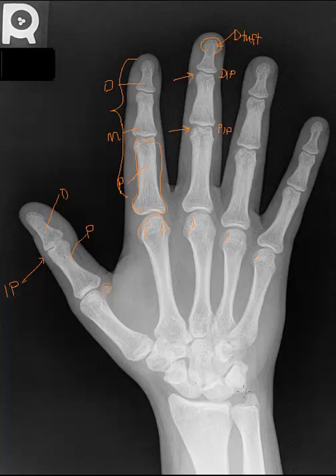There's another region that I wanted to talk to you about in the wrist, and this area is reserved for the triangular fibrocartilage. And fibrocartilage is not radiographically visible, but is still present. The reason why I'm discussing this region is because oftentimes students want to say that there is a ulnar carpal joint, and that's not necessarily true. This triangular fibrocartilage lives in this region and essentially cushions the space between the ulna and the carpals. So the radiocarpal articulation is the articulation that we really talk about, as it does have hyaline cartilage and is a typical normal joint space.